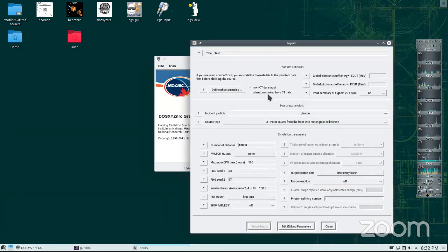Now, this part is the cutoff. I usually don't worry about it because it will always take the AE from the medium, from whatever is in the data file. But if you want something higher, even if you're simulating using the 0.521 AE, you might still want, for example, any electron with energy less than 1 MeV to just dump the energy, not simulate. You can adjust this here, but I usually leave it. I don't care about that.